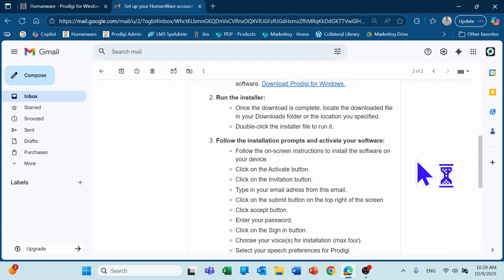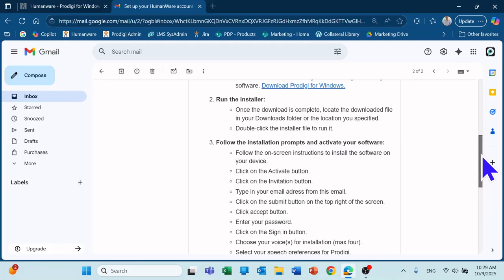Like here again, you would only go through this one time. If you wanted to use the software on another device, you would, after you've done this, be considered an existing user, and you would have a username and password that you'll want to remember. You can use that to activate onto other systems at that point in time.